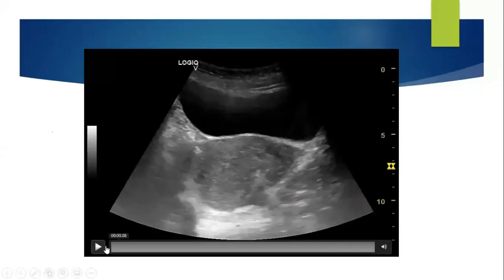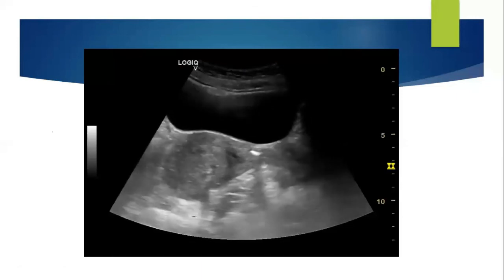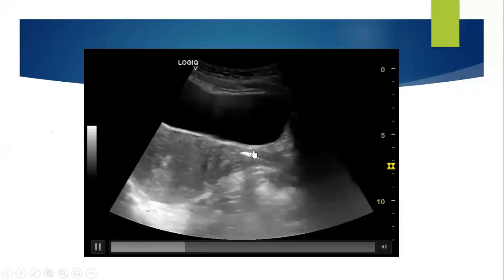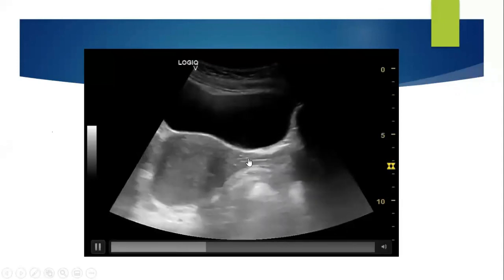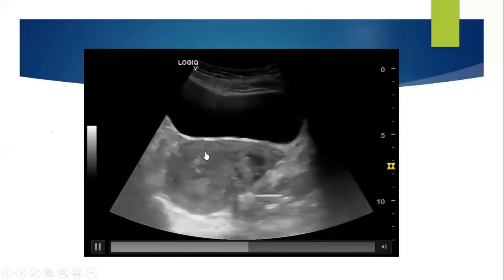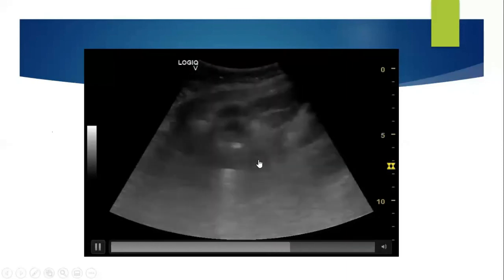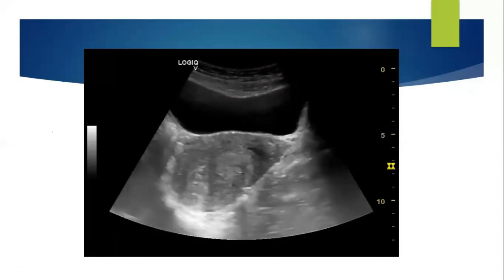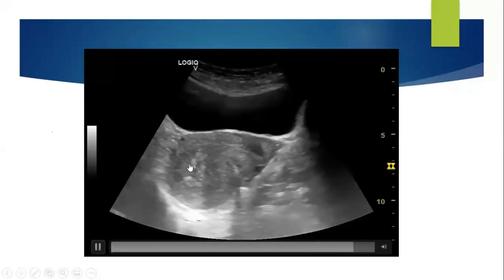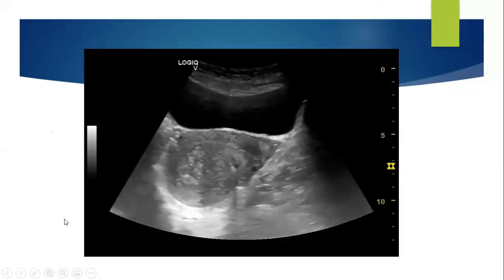See again this picture. This is a transabdominal scan. Now I won't tell you the answer. You tell me what all you can see in this. Nicely we can see an IUCD here, which is there in the lower uterine segment. This is a retroflexed uterus. So maybe while inserting the IUCD, the doctor couldn't put it right inside because of the position, and see, this lady came to me with an early pregnancy. And I will show you this. If you see here, the small uterine sac is also seen.